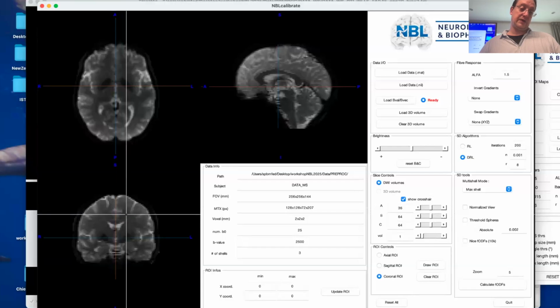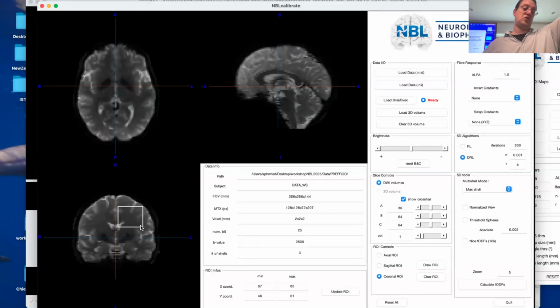You do this, you do that. Usually you choose two opposite corners for it. It's a square region of interest, so you define the two opposite corners of a square. And then we do invert X. Actually, let's do it wrong intentionally, none. And we do 15.